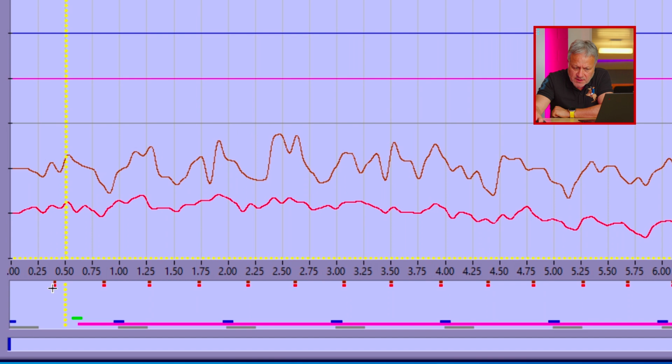What we've done is when we actually ran the EEG and collected the EEG, we also collected a trigger. And I did this to show you that when you do a combined acquisition of NIRS and EEG, then remember the light NIRS only has 3 trigger inputs. So if you wanted to use Presentation and present 8 bits, 255 markers, you cannot do that on the light NIRS because you only have 3 inputs, okay?